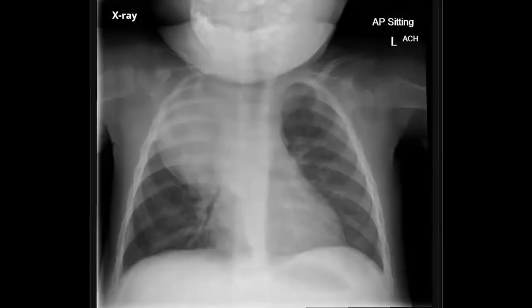As I told you, it can start with a nuclear case, and it can start as part of the study. So this case, what do you think? This patient came with this appearance in the X-ray. Is the lesion a lung lesion, mediastinal lesion, chest wall lesion, or neck lesion? Where is the lesion here? What do you think?